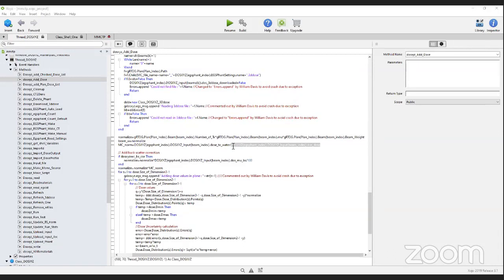That straight value that we had in the profile, you use. And in my calculations for the presentation I gave, you wouldn't invert as well because we're inverting within MMCTP. We invert that value. So this is the real line. So it's very simple. That's why I was getting 10 to the power minus 25, because it's probably inverting twice. Yes, that's exactly why. Okay. Sorry about that, everyone.